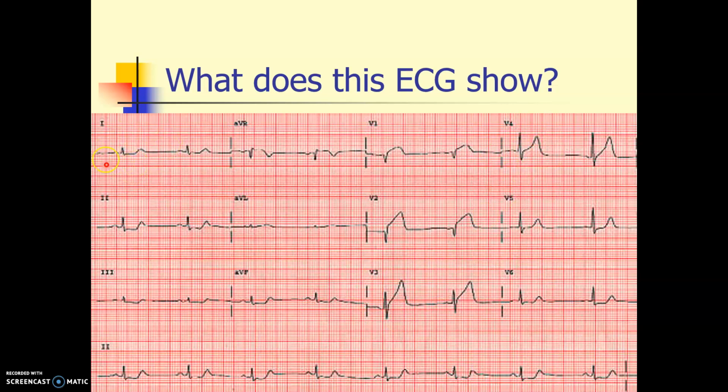There are reciprocal changes in the lateral leads and the inferior leads. This is in fact a septal infarct which is extending somewhat to the anterior surface of the heart. So an anteroseptal STEMI.